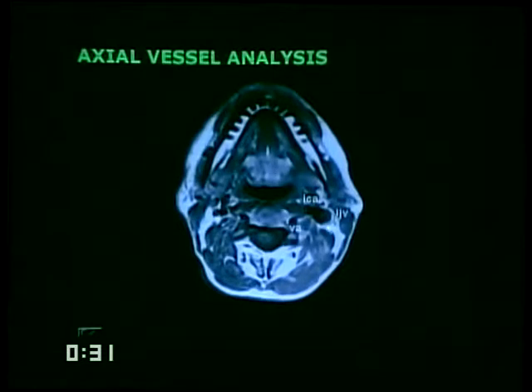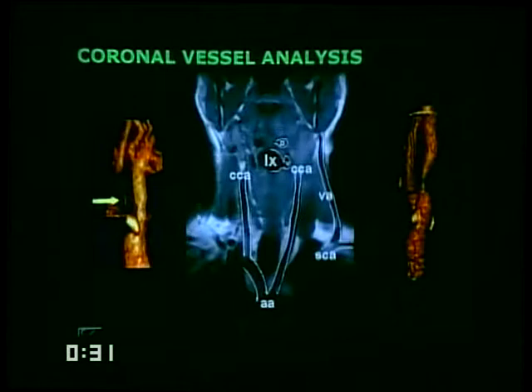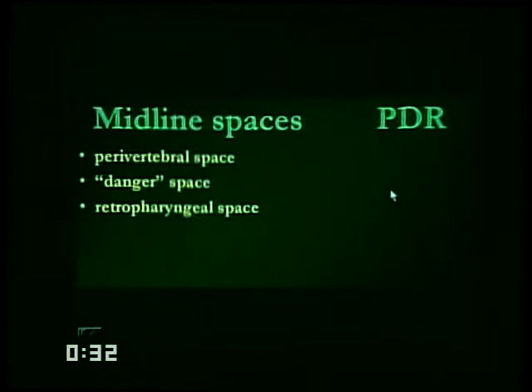Notoriously, the jugular vein is quite asymmetric compared to the other side. This is a variation of normal. Be aware of this and recognize this artifact. You can also, with more experience, visualize the major blood vessels on the coronal plane, but that typically is a stroke of luck, because not all of the blood vessels in all patients are going to run in a curvilinear fashion. There's going to be a lot of tortuosity, especially in older patients, so you're not always lucky analyzing them in the coronal plane.